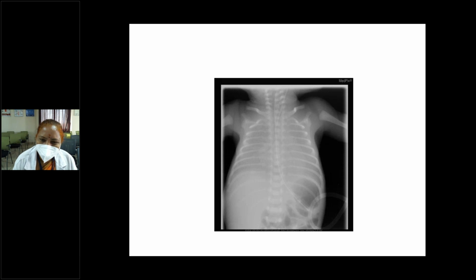It's like a total ground glass appearance. Thorax X-ray chest with ground glass appearance, but we are able to see some trachea and air bronchogram. Can you see this? This is the trachea, carina, division of right and left main bronchus, and this is air bronchogram. So it's a case of homogeneous opacity in the lung fields, ground glass appearance, newborn X-ray: hyaline membrane disease due to surfactant deficiency.